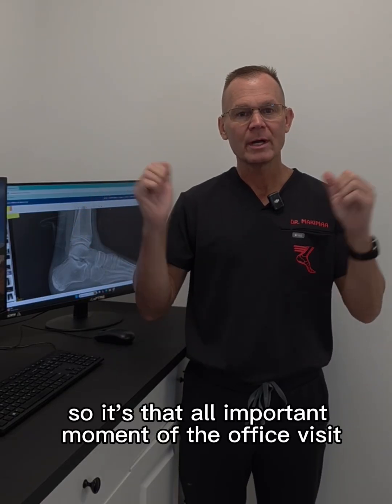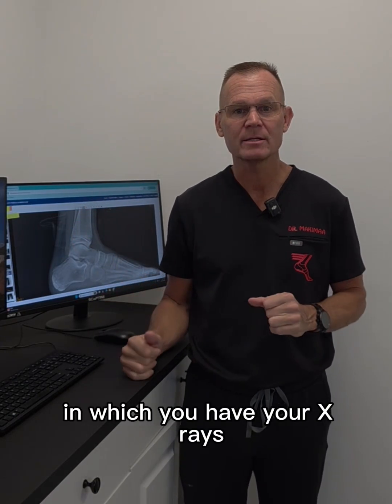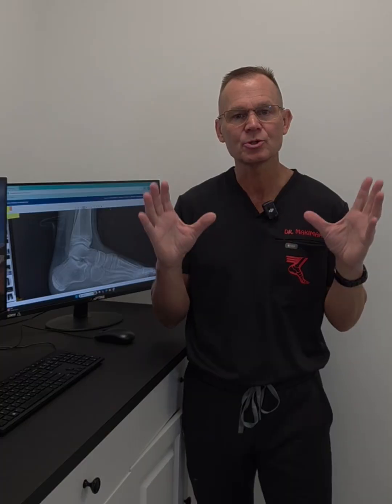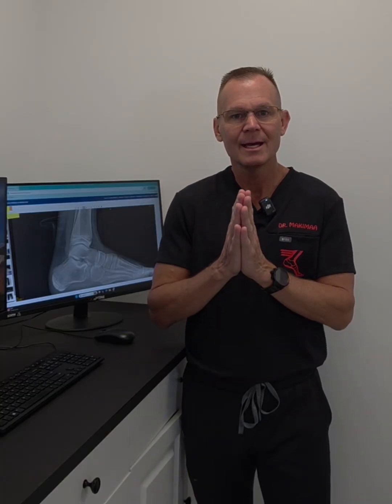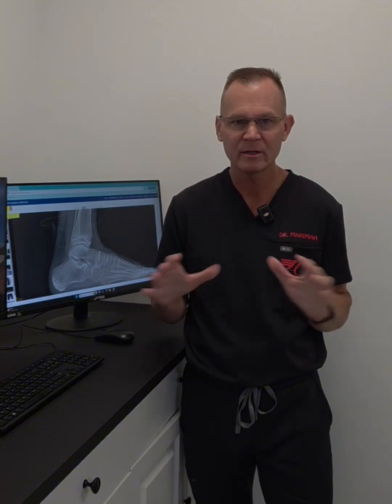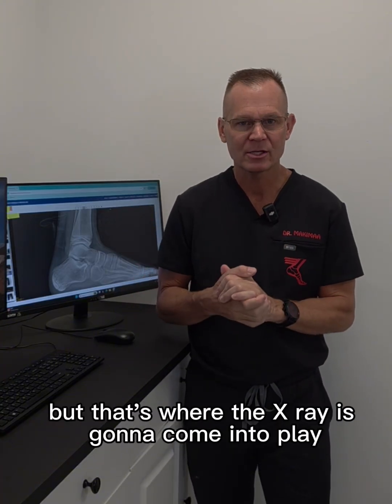X-rays. Okay, so it's that all-important moment of the office visit in which you have your X-rays, because this patient, if they've done any research or talking to their friends, is convinced they have a heel spur. It's probably the only thing the general public knows about heel pain: a heel spur. So they're all convinced they have a spur, and they may have one, okay? But that's where the X-ray is going to come into play.